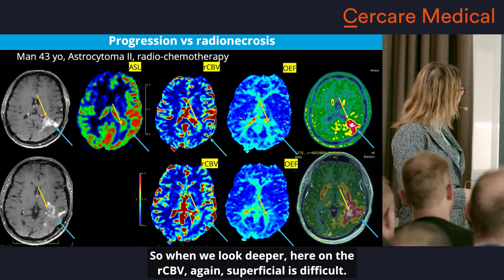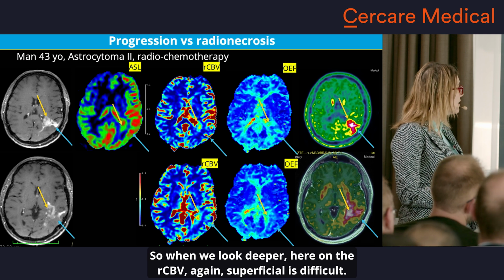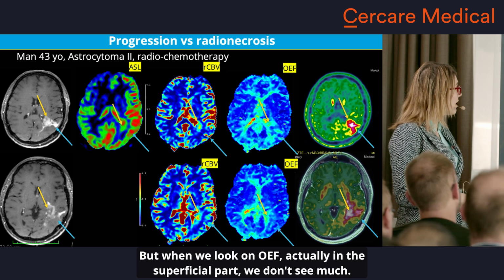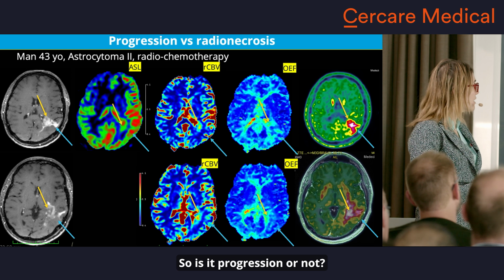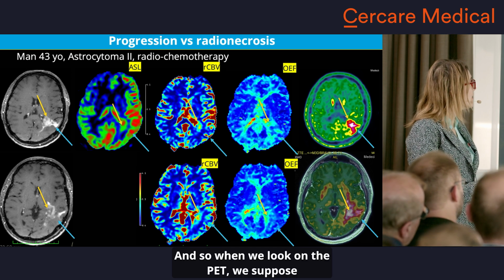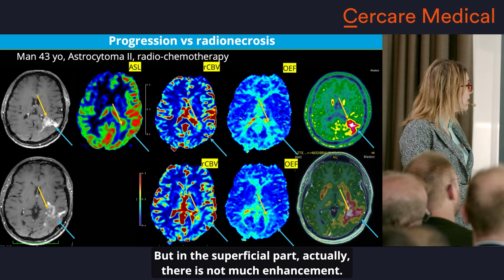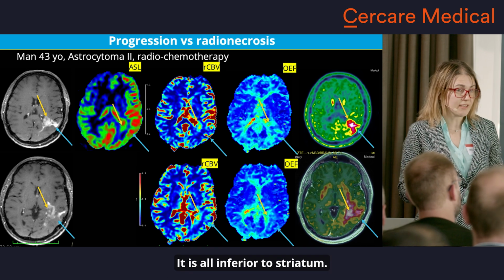So when we look deeply, here on rCBV, again, superficial is difficult. But when we look on OEF, actually in the superficial part, we don't see much. So is it progression or not? Let's look on the PET. And so when we look on the PET, we suppose that in the deep part there is a progression, but in the superficial part, actually, there is not much enhancement. It is all inferior to striatum.